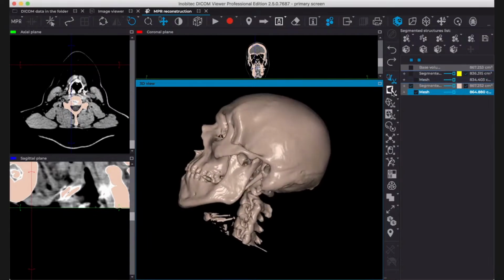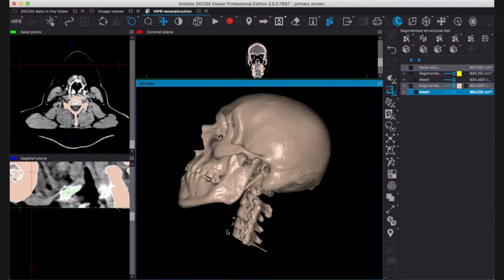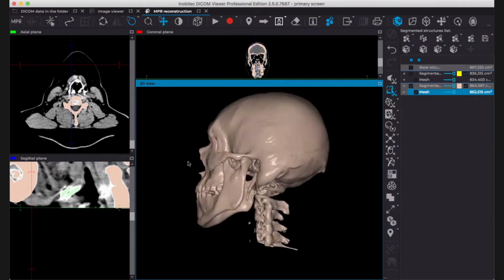You can also use this one, which is the inverse polygon cut, which means that we'll cut everything which is not what you have selected. You see, we have another color for this line, which means we are using the inverse polygon cut. And now everything that I selected is still part of my 3D model, and the other part was deleted. We have an easier way to do this. I will do Control Z again.